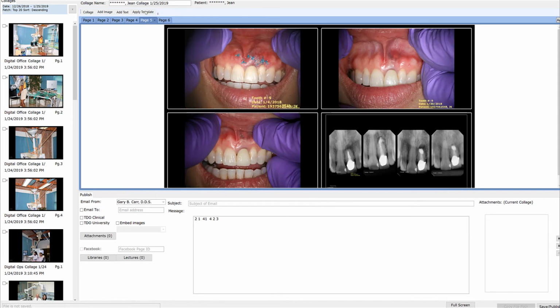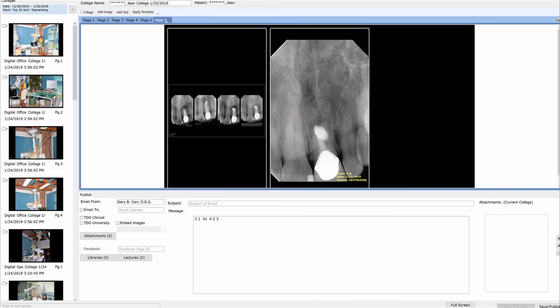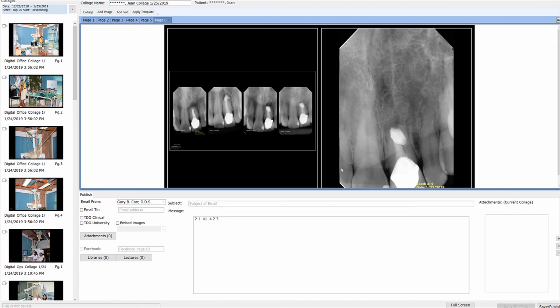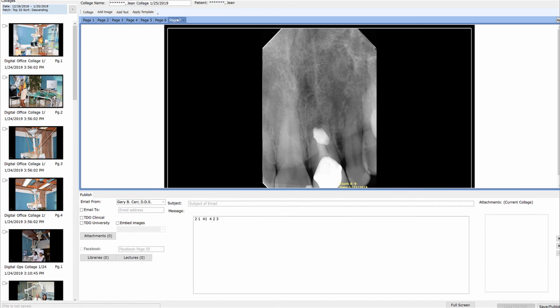And then I want this to be 3. And then I want this to be 2. So you can change your mind in the middle of this. Or let's see, this would be better, maybe 1. And that is 1.